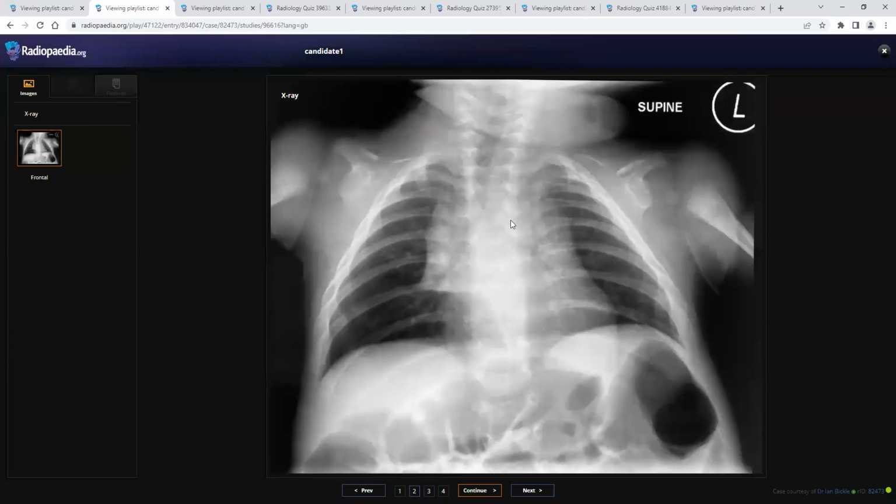This is very much important when you see a case. An abnormality which is bilaterally symmetrical is very difficult to pick up by the human eye. That's the one thing. This case is for that only.